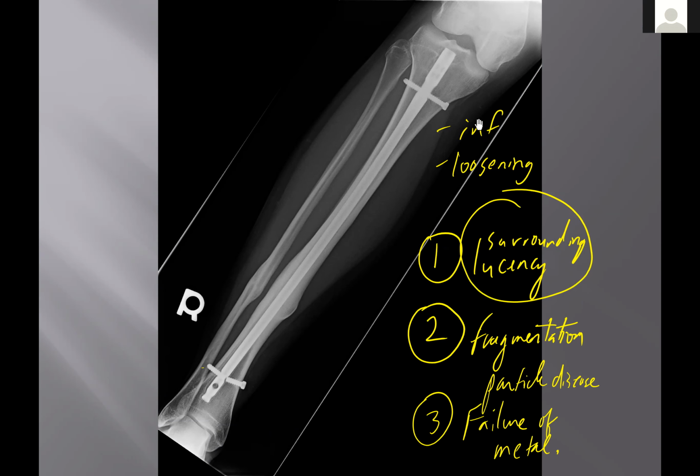Okay, doctor. Sorry, one more time. Yep, hit me. An intramedullary rod like that, that's obviously been in there quite a while, well-healed bone fractures. Is that movable? Yeah, that's a good question. Can it possibly move at this point, with or without functional screws? Yeah, I don't think the actual big rod could possibly move.